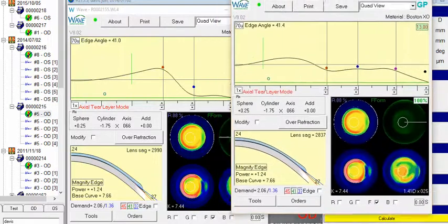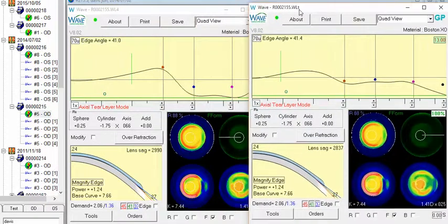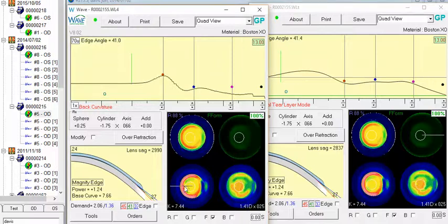And then basically in this extra lens, I referenced using the 8-point Wave design step for designing a large diameter lens, and I've included another link to this email that has the tutorial for how to do a lens like that. But basically what I was trying to do is, especially if we look back at your design in this 9 o'clock radial, you can see you have some ups and downs in here.